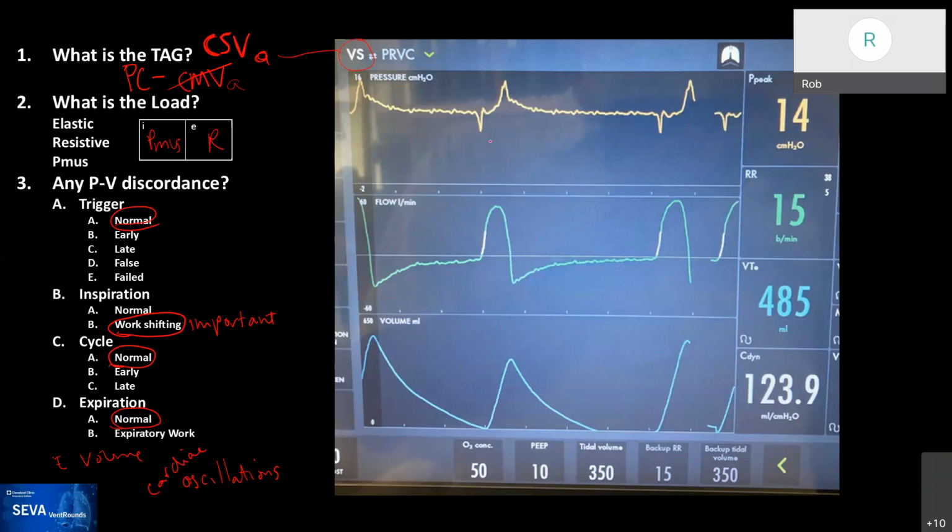Yeah, the only challenge, and this is the problem with nomenclature, is that when this ventilator is in auto mode, it will say auto mode. Here these little arrows, Rob, just mean backup. So it's just a backup in case the patient goes apneic. Okay. So I think that your read of PC-CSV is absolutely correct.